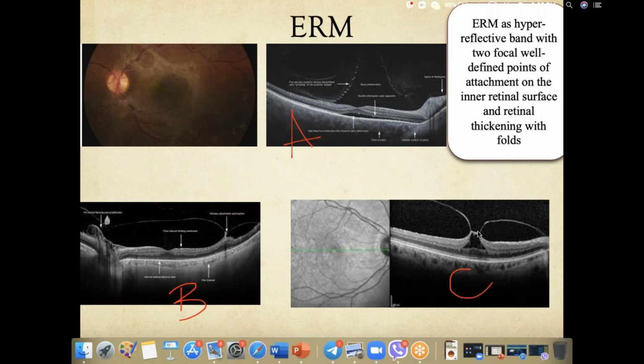The treatment for C is vitrectomy. You cannot do anything else. There are certain things like ocriplasmin and all those things. We do not use it here. In this eye, do not use Avastin. Avastin or any anti-VEGFs only make the vitreomacular tractions and ERM worse. In this case, observation. Over here, since the retina is already detached, you have to search for the breaks, where the break is.